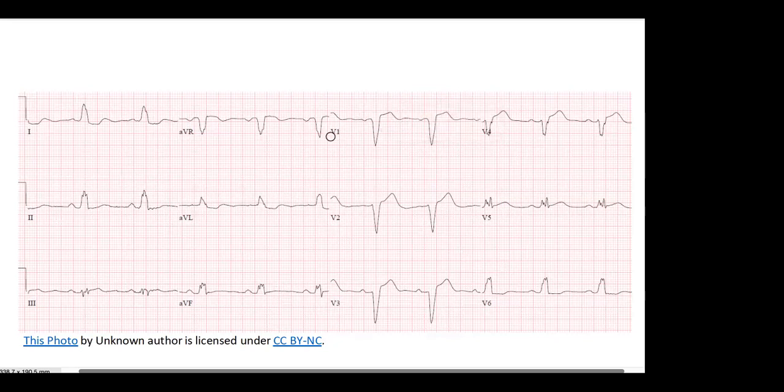Yeah, so left bundle branch blocks are much more important than the RBBBs, but the RBBBs can also occur as a sign of a heart attack, though more often you find this type of ECG. You don't see any pure ST elevation. Okay, in this case, you see an ST elevation here.